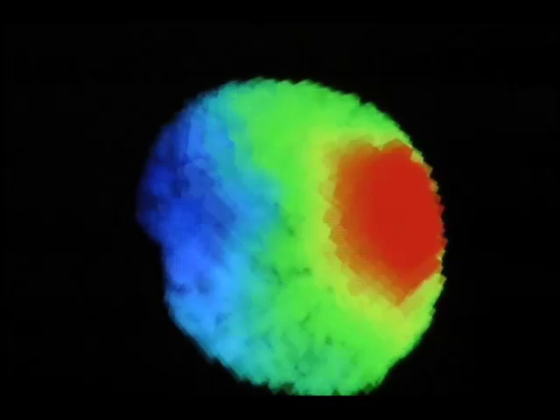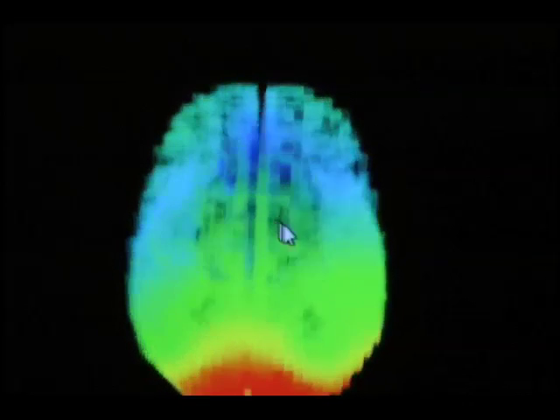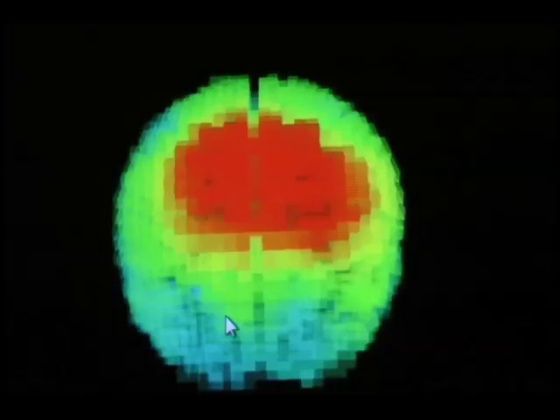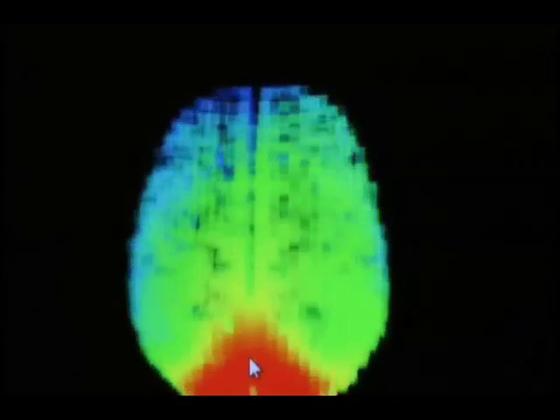And now we're looking at the beta activity in the sLORETA. And again, we see predominantly posterior in this case, although we see a little bit of anterior activity as we roll the head up and look over here. And we see a little more activation on the right. And as we then switch from beta to high beta, we see even more of this tendency where the high beta is more lateralized on the right-hand side.